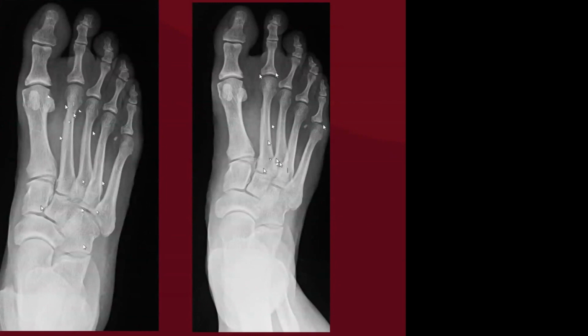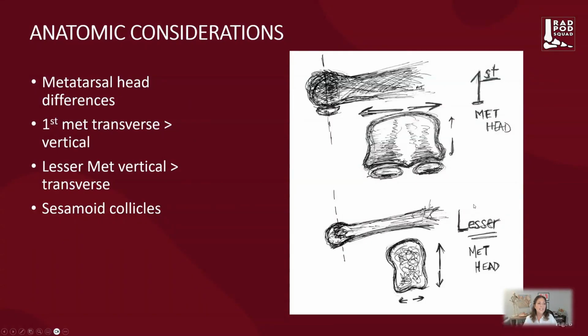In other patients, we might actually see flattening of the second metatarsal head as the biomechanics of the second MTP joint is altered, creating a situation that creates accelerated osteoarthritis through our second MTP. Looking at anatomic considerations in metatarsal head size, we begin to see form and function.